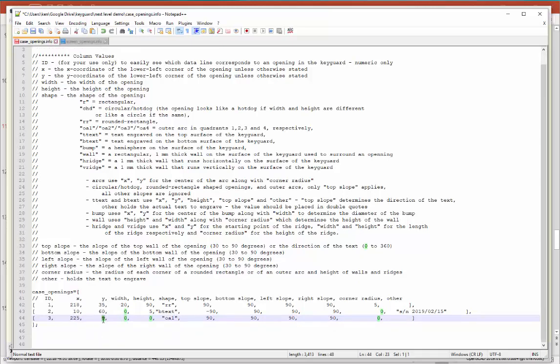In the Y direction, because this guy's on the bottom end of the opening, it's got the 35. And we're just going to go really gentle with this corner radius to start with. We'll just use 2 millimeters. And we can have a slope here, but again, the outer edge of the keyguard is a 90-degree cut, so we'll leave it at 90.